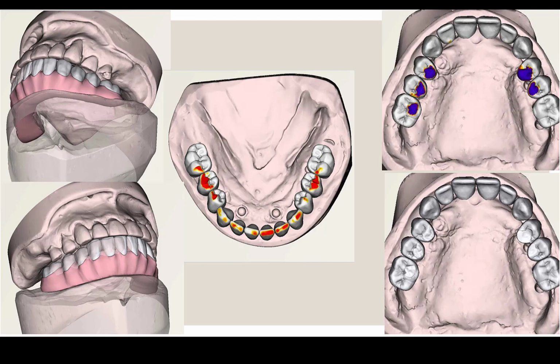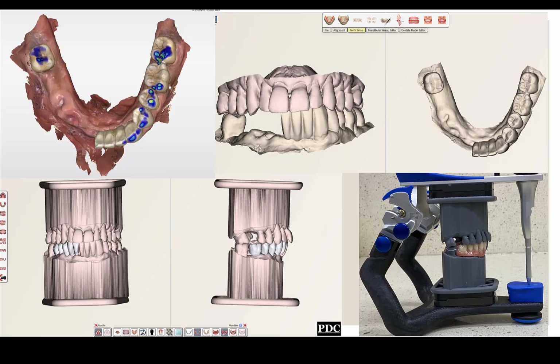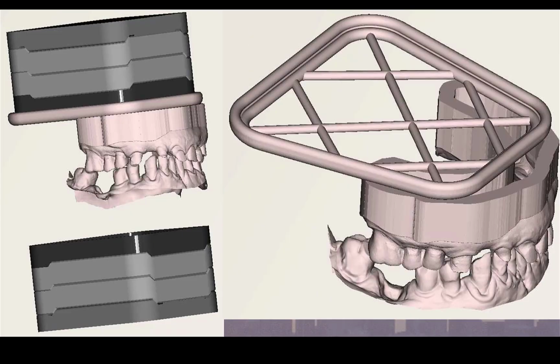This is especially useful when doing partial and full arch arrangements opposing natural dentition, which may not always support an ideal occlusal plane. There is a virtual grinding feature in PDC which can be selected, which adjusts the occlusal surfaces of the teeth to accommodate opposing uneven contacts. Intraoral scans are also readily accepted by PDC. You can clean and solidify models for easier acceptance by printing software, as well as still mount on the virtual articulator. No need for mounting stone.